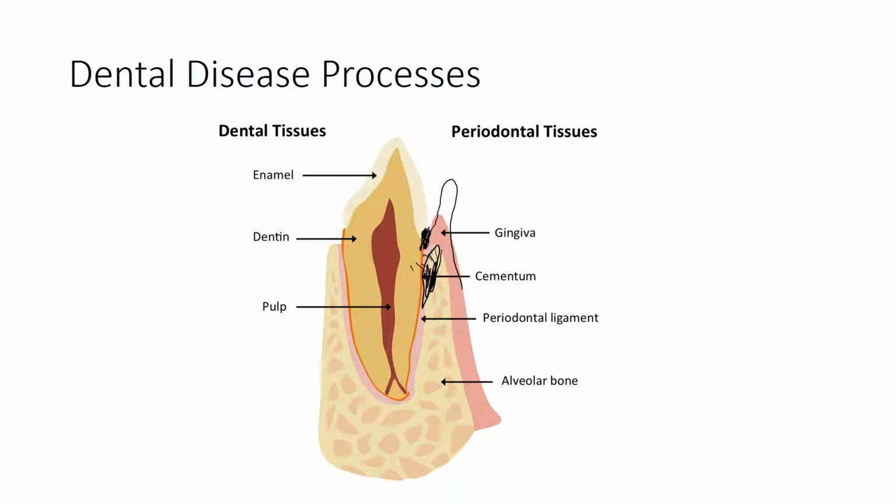And the bone loss typically at the beginning is what's called vertical bone loss. And it leaves this vertical strut of bone that kind of props up the soft tissues and maintains an even deeper gingival sulcus, which again is difficult to clean and bacteria proliferate, and it's kind of a positive feedback cycle.